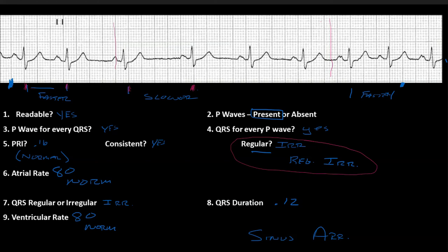For us, we have to take this into account and take a look at the patient. That is the ultimate goal. Take a look at the patient, but usually, this is related to a respiratory pattern. For us, that's one of the big keys. And then look at your patient. This is the key. Every time you go to take a look at an EKG, you have to put it into context with what your patient is about. So this is sinus arrhythmia.